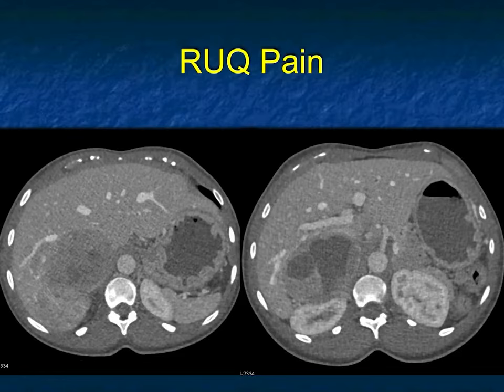The 2 things I think about most would be a necrotic primary adrenal cortical carcinoma. That would be a good thought. The second thing with cystic lesions that are large, that are somewhat vascular, I got to think about a pheochromocytoma. Other unusual large masses, metastasis could be considered. If you had a history, melanoma and hepatoma are the ones that give the biggest masses. You can get vascular masses from renal cell, but the kidneys look okay, and usually the metastases are smaller. Other unusual tumors would be considered, but I'm sticking between pheo and primary ACC.